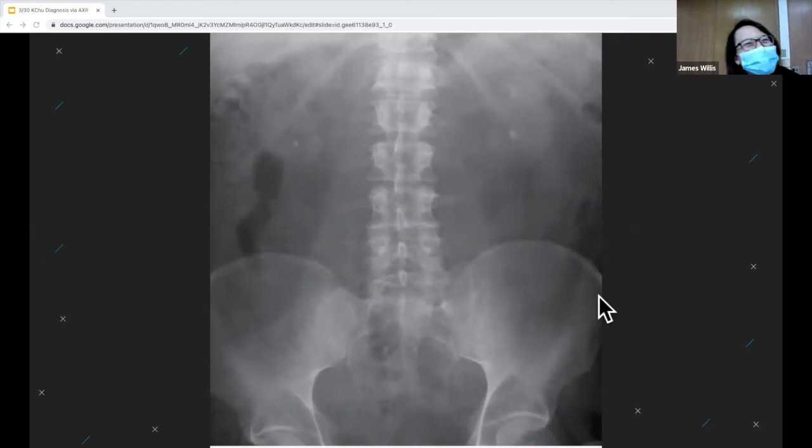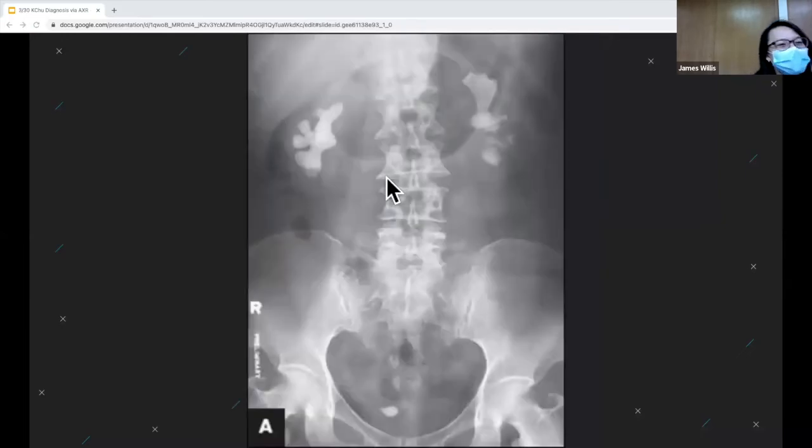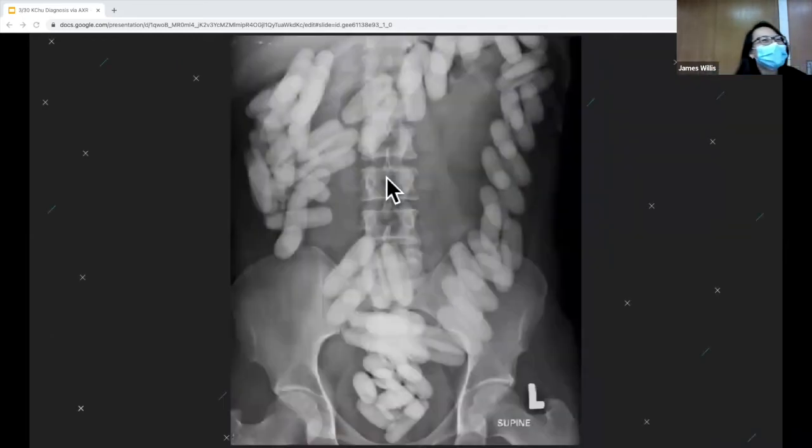Sarah? Here, I'll give you some hints. These over here. Yeah, these are kidney stones. This patient has bilateral renal stones. Great. Subham. That is correct. Staghorn calculi. Okay. Abner.